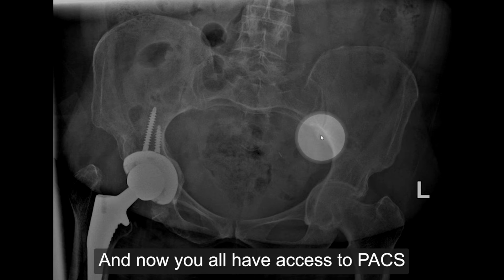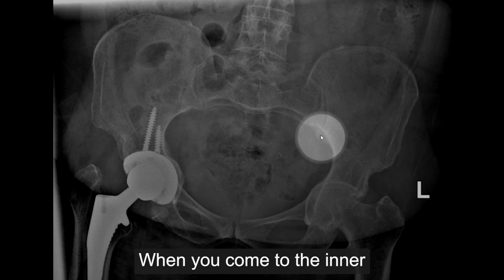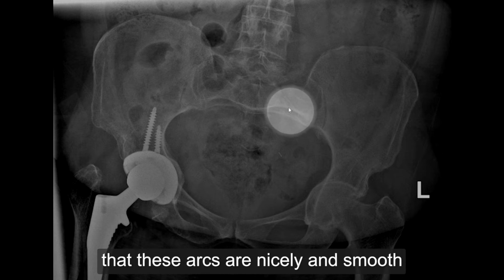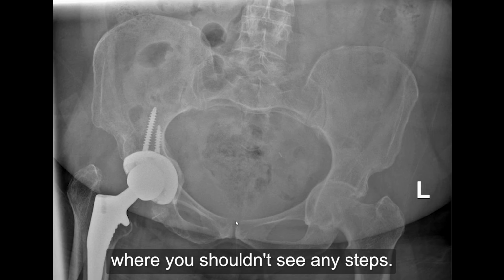And now you all have access to PACS and you can do this quite easily where you're practicing every day. When you come to the inner aspect of the sacrum, you need to make sure that these arcs are nice and smooth without interruptions, and keep following the inner aspect of the pelvis here where you shouldn't see any steps.